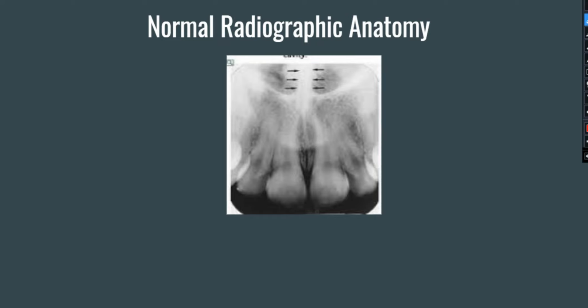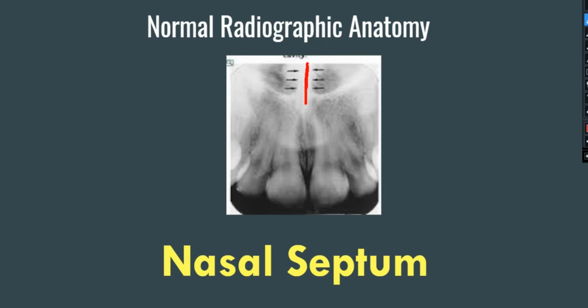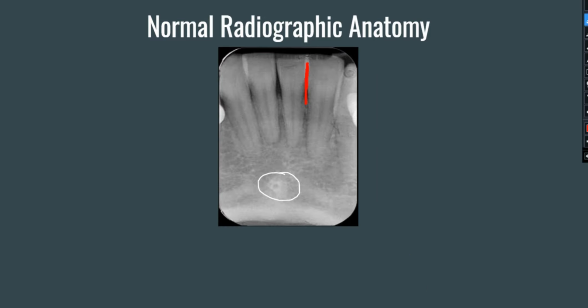Again, where the arrows are pointing, I'm going to trace over this white bony partition. The nasal septum. Next, the radiopaque ring.